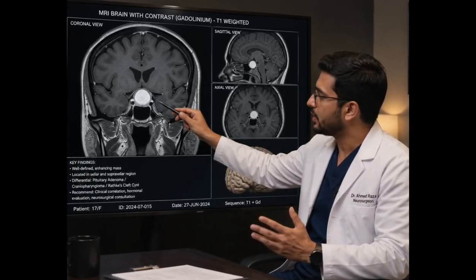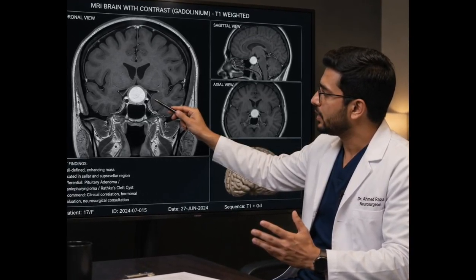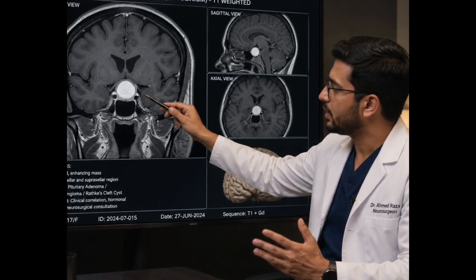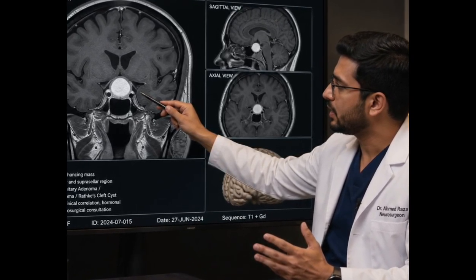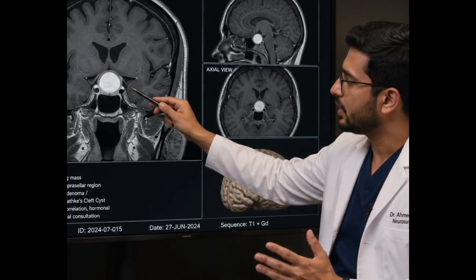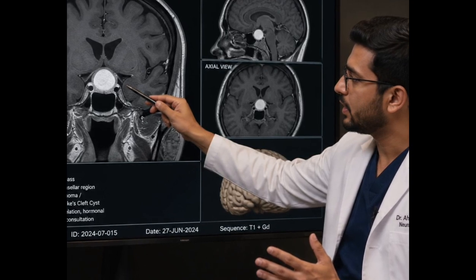The primary image on the left is a coronal view, which slices the brain from front to back. The smaller panels on the right provide additional perspectives: a sagittal view, side profile, an axial view, top-down, and a 3D volume surface reconstruction showing the external anatomy of the brain.